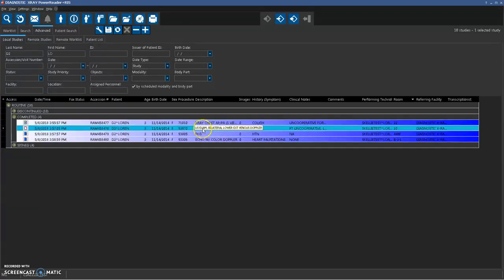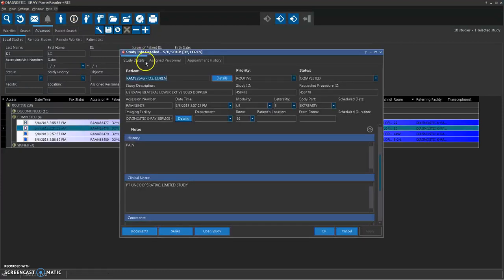So first off, it's very important to make sure that the study info is filled out correctly first, either by the care coordinator or yourself before you go into the document template area and start to generate a template. So you just want to open up your study info and review everything and make sure that if you're the one entering the exam info here, that you definitely choose from the drop-down list. This chooses the correct modality and body part and all those sorts of things that are important to make sure that the correct template is generated automatically for you. So just go through that first.